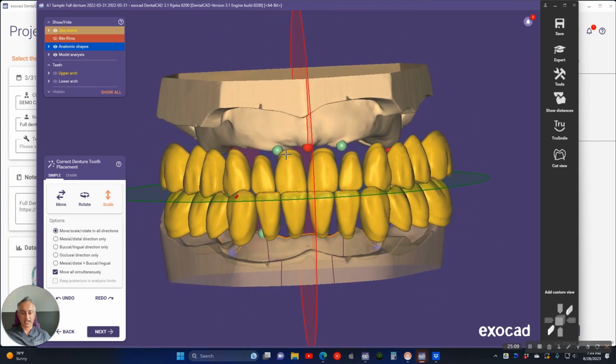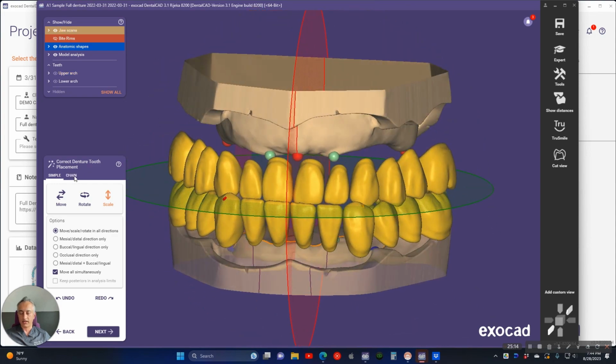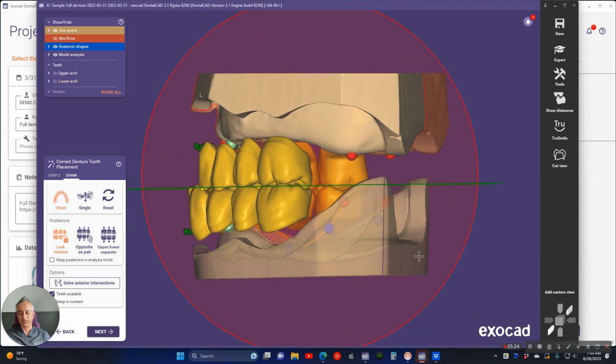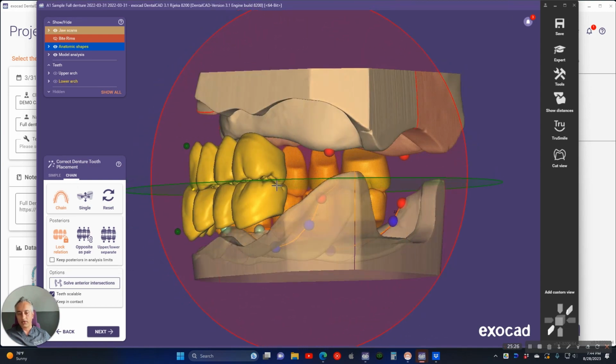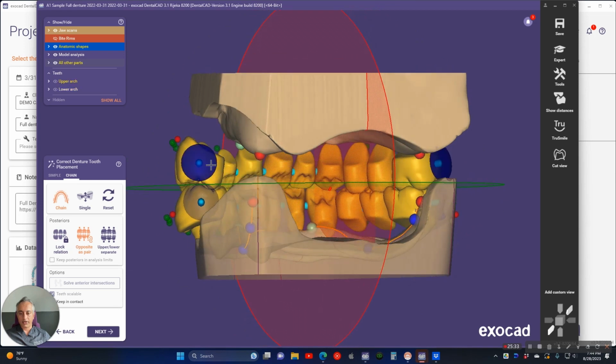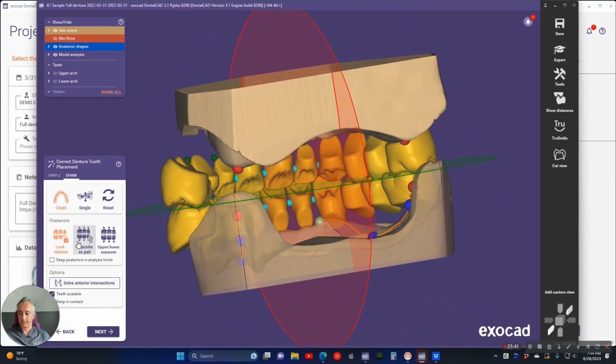I like my anterior size right there. The posteriors will end up in the right spot. So let's go ahead and get started with positioning everything. What I like to do is keep everything as separate, and the posterior will keep it locked together. The anteriors will flip-flop. In chain mode, we are going to move opposite of the pair. And now you can see I have my discs where I can adjust the posterior, because if I locked the relation, I can't move my posteriors, but I need to because they're not in the right spot right now. So let's go ahead and move opposites as a pair.